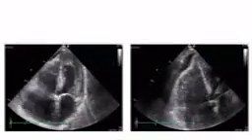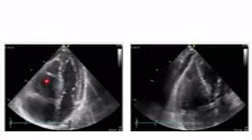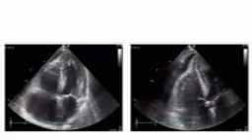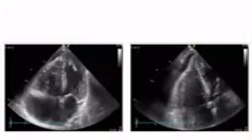So let's put everything together that Anna just said. Here is another example. This is a patient where you can definitely see that the right ventricle is dilated, again, compared to the left. You see that function is poor. The patient even has some degree of pericardial effusion. Now, if you do not have the clinical information, it's very difficult to understand why the patient has these findings. But if I tell you that he came in because of chest pain, because he had deep vein thrombosis, and we found an elevated D-dimer, well, then the diagnosis is quite clear. Most likely, this is pulmonary embolism, and that's also what we found in CT.